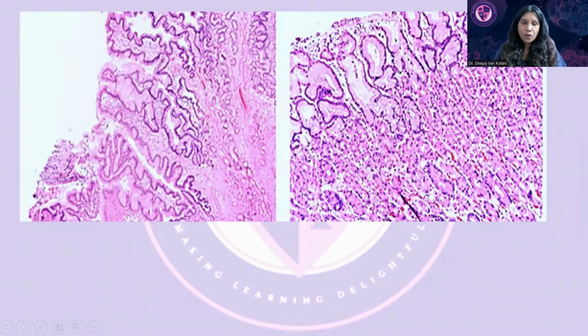So morphologically, when you're assessing it, this is also the cardia-type of esophagus, the gastric cardiac mucosa. When you're looking at this, they lack goblet cells. They have mucus cells. Without goblet cells, the diagnosis of Barrett's esophagus should not be made, and it should be made very consciously. The clinical significance is, why are goblet cells very important? Because intestinal metaplasia is the only thing that is the precursor for adenocarcinoma.